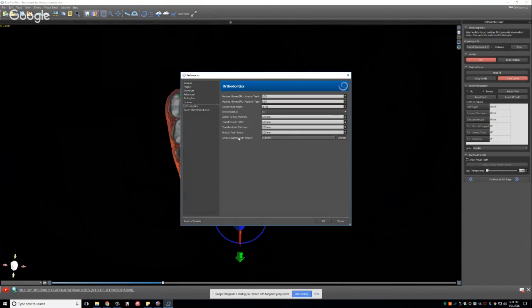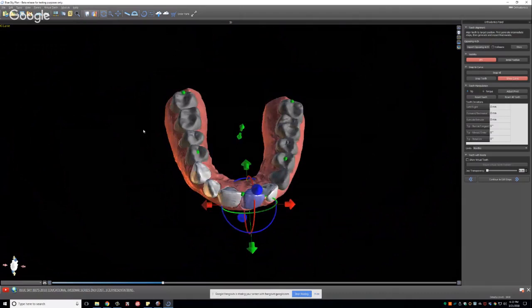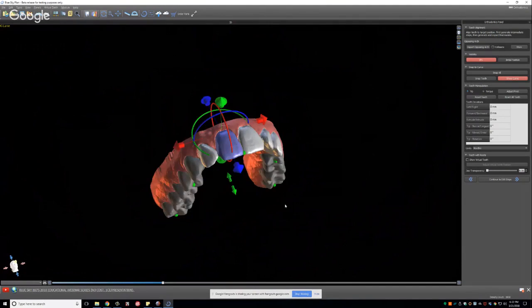It's going to ask you the gingival augmentation amount. And you're going to have the option of 0.2, 0.4, 0.6, and 0.8. I can't really see any need for 0.8, but we did do some kind of survey into some of our bigger users and asked what would help. And so these are the options we gave. So anyway, 0.2 is where I leave it. And once you set that, it won't pop up again. If you reinstall the software, of course, it will ask you again. Okay, so that's the first thing, one of the updates in this screen, in this phase, if you will.